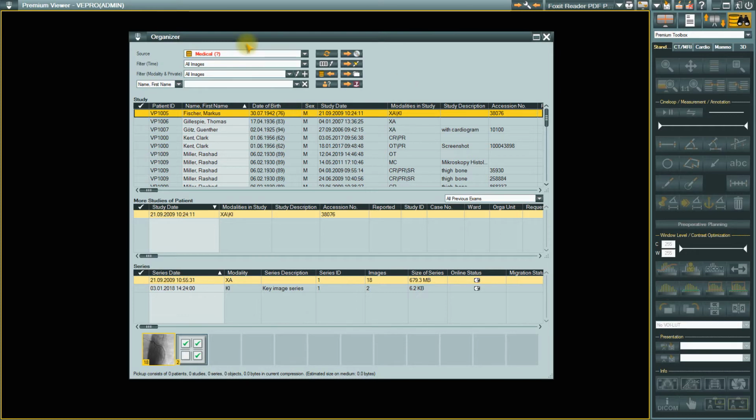If the data is not consistent, these objects will only become visible in the Discrepancy Archive. For final archiving, they have to be corrected there. You will be able to see whether data are in the Discrepancy Archive if the name of the medical archive is written in red and there is a question mark behind it. In addition, you will receive a message if data have already been in the Discrepancy Archive for more than 15 days and have not been corrected.